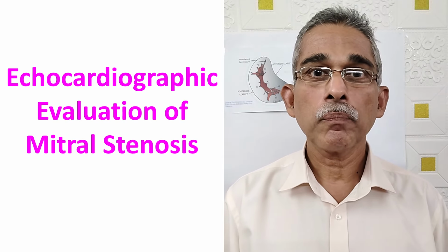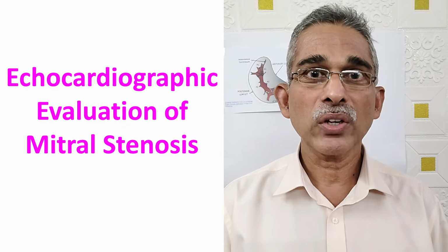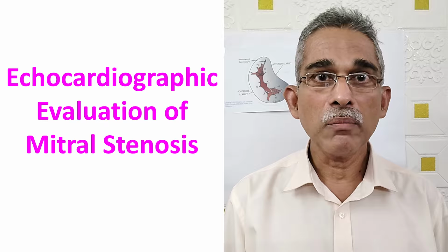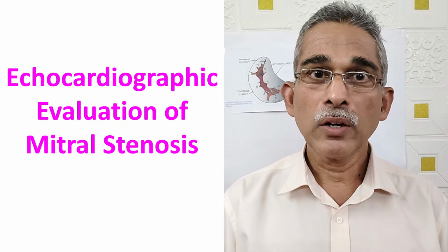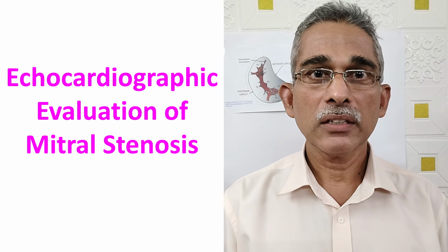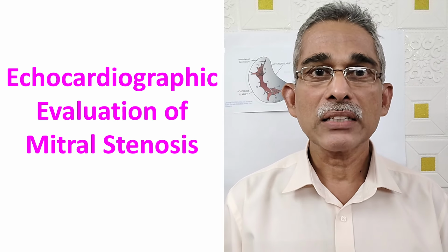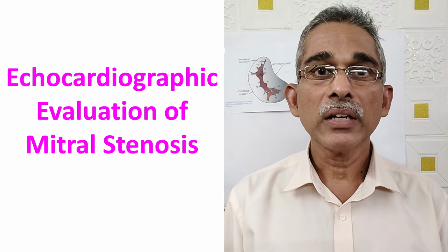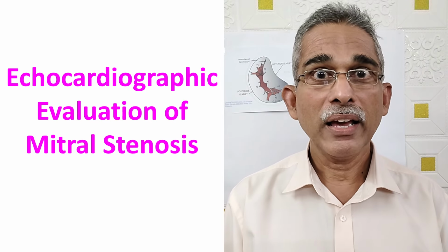So when you are thinking of balloon mitral valvotomy, a good echocardiographic evaluation is essential to assess the valve morphology and suitability for balloon mitral valvotomy. During the procedure also, it is helpful to assess success of the procedure as well as to see if there are any complications like increase in mitral regurgitation or pericardial effusion.